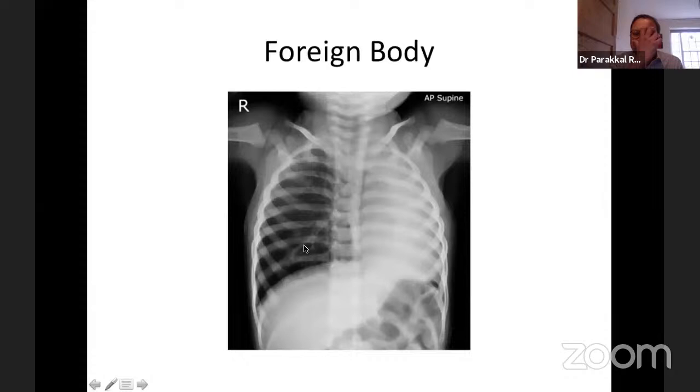Foreign bodies can present in more ways than one. And in this case, if you look, and this is where it gets a bit tricky, because to differentiate which side the foreign body is on can be quite tricky in pediatric patients. And especially since you're struggling to even get a history. So sometimes you can have a 3-year-old who mom gives a classic history of was either playing with a toy or was eating peanuts when he suddenly coughed and spluttered, which you can understand for a 3-year-old.